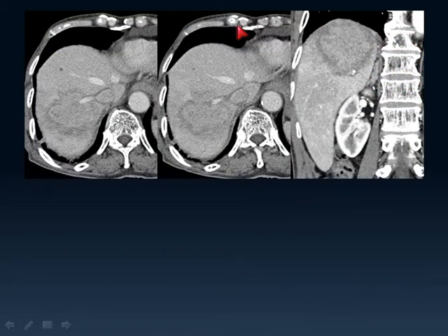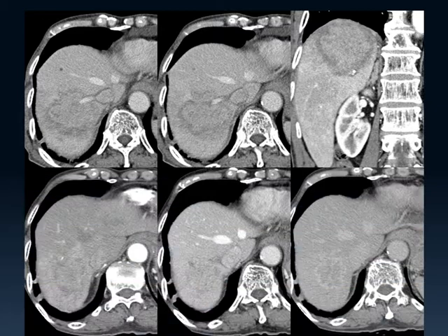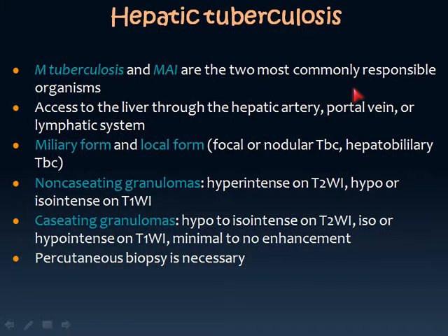This is another example of hepatic abscess. It looks like cholangiocarcinoma. However, there are quite different imaging features of cholangiocarcinoma and hepatic abscess, because usually the central portion of the cholangiocarcinoma shows low attenuation because of abundant fibrotic tissue. The patient underwent ultrasound-guided biopsy, and pathology revealed hepatic abscess; the lesion decreased on follow-up CT scan.